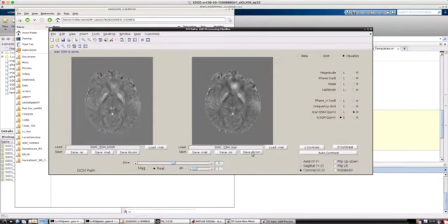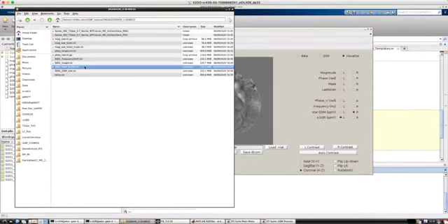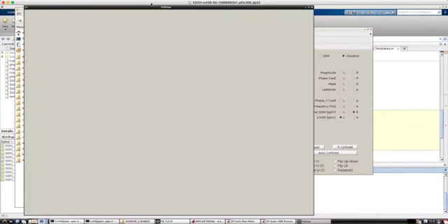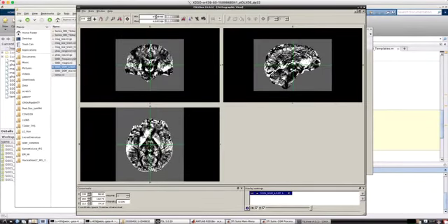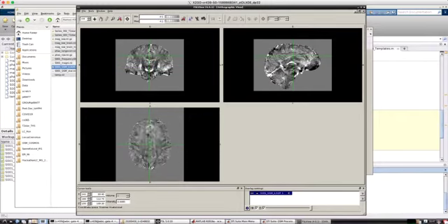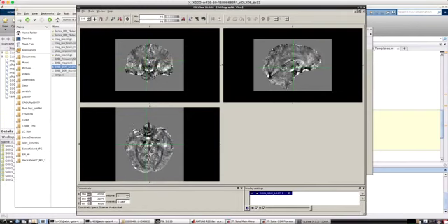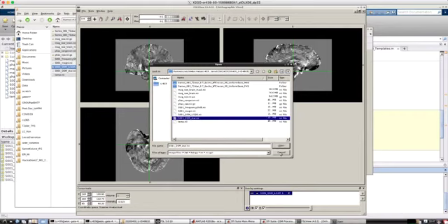You can see, if I save this as NIfTI as well in your current folder, and if I upload this in FSLeyes, or FSLView, sorry, you can see the differences better in this 3D view plane. Usually I like to scale it between minus 0.1 ppm and 0.1 ppm, so you find that this is the iLSQR method. Looks pretty good.